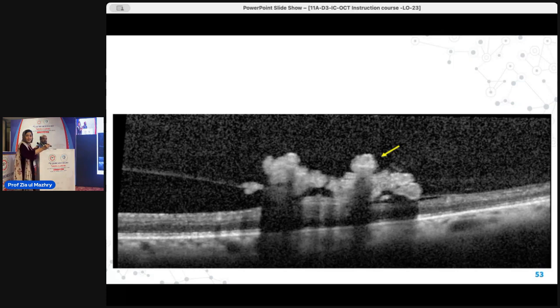So as I already said, the patient is diabetic. This is a bunch of neovascularization that is growing into the vitreous, and these vessels are causing shadowing here, because of which we cannot see the layers here. This is a case of proliferative diabetic retinopathy. This is an image taken from American Academy of Ophthalmology. Okay, I have a question for you: these new vessels that are developing, why are they not developing on that side, why only here?